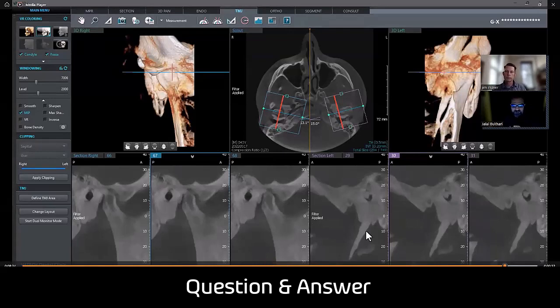So earlier, I did mention something about one of the calcifications that we can note in CBCT imaging, and that's the stylohyoid ligament. So in this MIP, where the arrow is on the left side, we see the arrow pointing to what is a part of the styloid process. And the styloid process is a projection, right? And off of that comes the stylohyoid ligament.